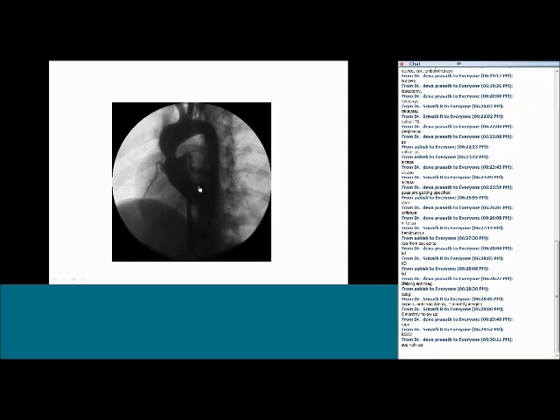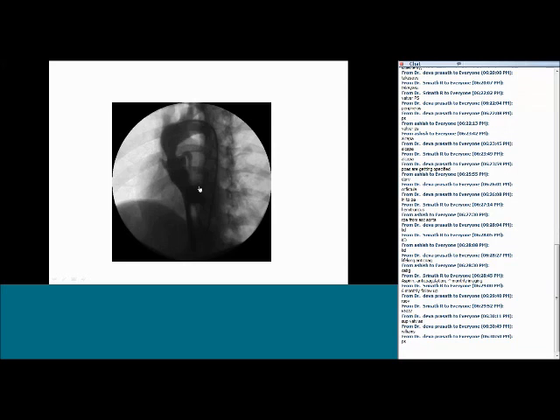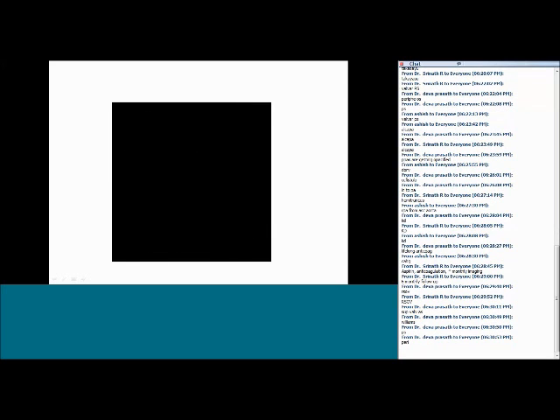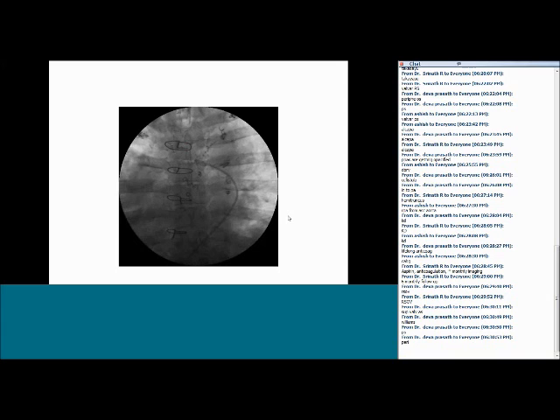Very clear-cut. So now think and write. What other angio should you take in this patient? And usually which syndrome is associated with this? Yes, Williams and peripheral PS. So any patient who has supravalvular AS, you should definitely do a pulmonary angiogram to make sure there is no peripheral PS. Excellent.